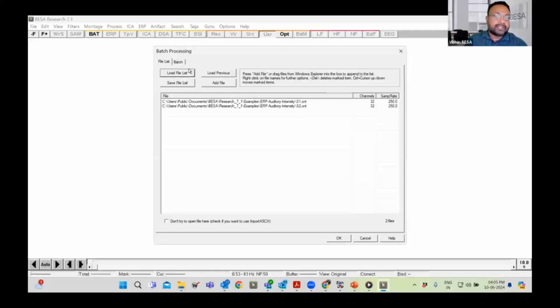Now, in some cases, due to wear and tear of the caps or the electrodes, by the time an experiment has run for, say, 30 or 40 subjects or patients for that matter, some of the electrodes might be broken. In those cases, you might not have the same number of channels in all subjects. This is a common scenario which can be faced. In the further steps, we have certain solutions for this kind of problem. We will get back to that shortly.